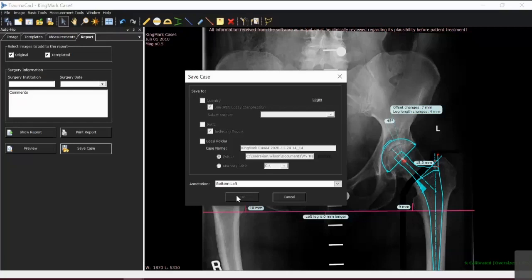And so you'll have a good idea, and the operating staff can have a good idea, what you want and what you've planned. Obviously, we can't be 100% right all of the time, but provided the preoperative X-ray is of a good quality and has a calibration device on the image, it's highly likely that the component you've chosen will be the same size that you actually insert, or it may be one size either side typically. So you can see that this can very much positively affect the workflow.